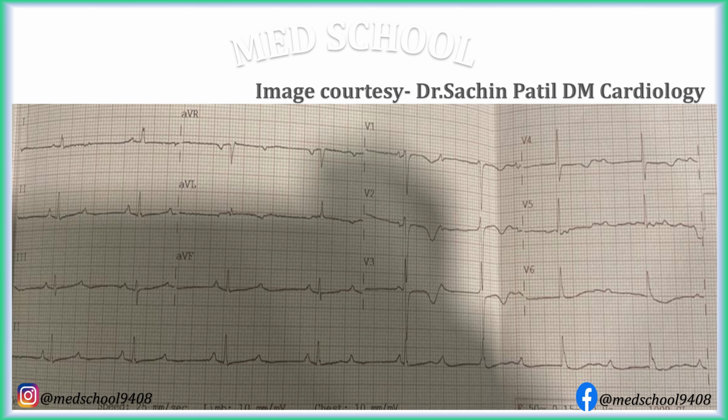In this ECG, QRS complexes are dropped after every alternate P wave. To know if there is PR prolongation or not, at least 2 consecutive PR intervals should be present there. So from this ECG, it is impossible to know whether it is Mobitz Type 1 or Type 2 AV block. This is called as 2:1 second degree AV block, which is difficult to classify into Mobitz Type 1 or 2 from ECG alone.